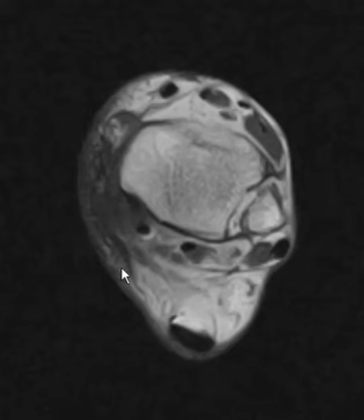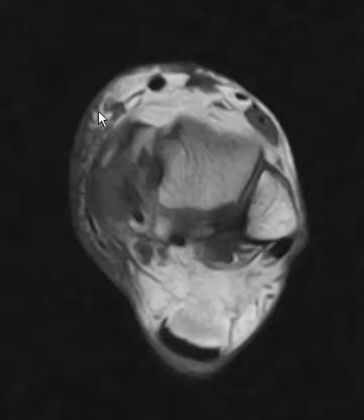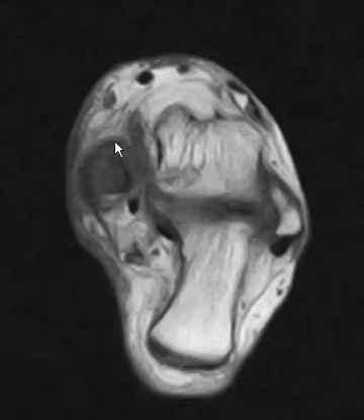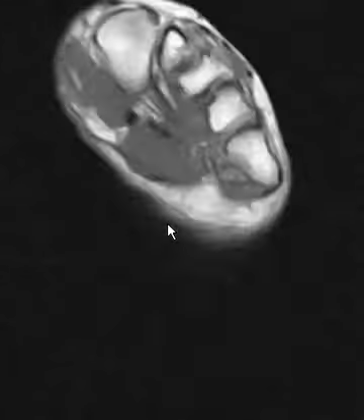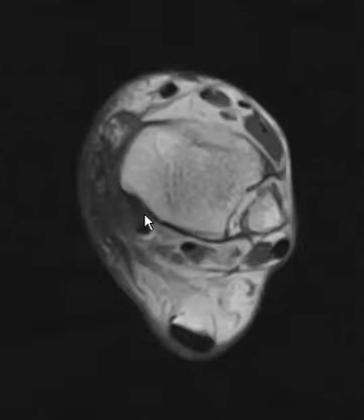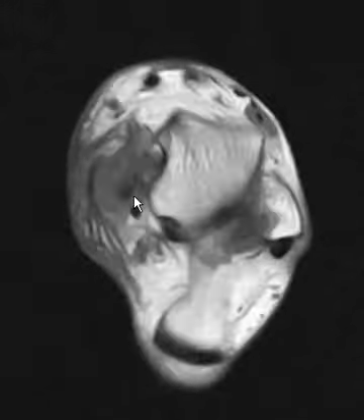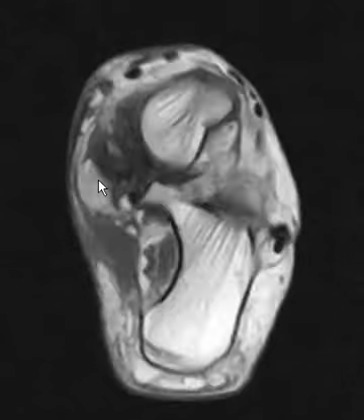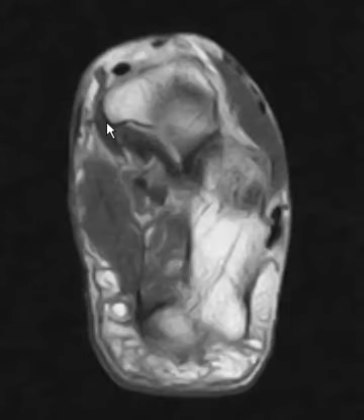Lots of edema in the soft tissues around here. This is really big and puffy and swollen when I saw her clinically. And this whole tendon is just huge. And if we follow this above, this is pretty high above the ankle. You see it's in the supramalleolar portion. And down at the level of the ankle joint, it's still there. And then the inframalleolar portion is even larger. And it goes all the way down to the navicular attachment.